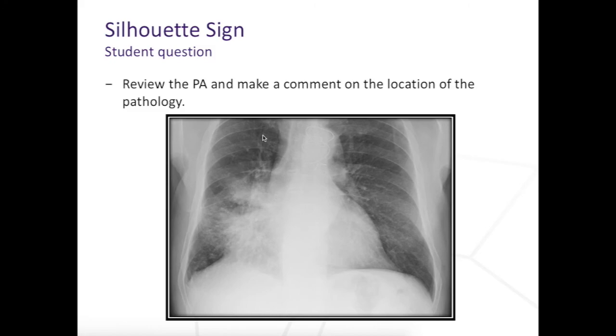So the right lobe, so then you should immediately go, all right, right lung, there must be 3 lobes, so it must be an upper, middle, and lower, and hopefully just by doing that, you go, all right, this pathology is very centralized in the chest. It's right next to the right cardiac border. In fact, I don't see the right cardiac border. I see a little bit of the diaphragm there, but not as well as I should. That is alarm bells for right middle lobe collapse.